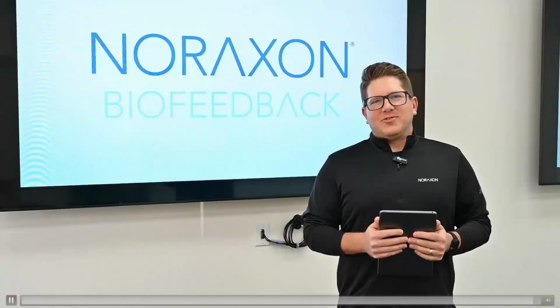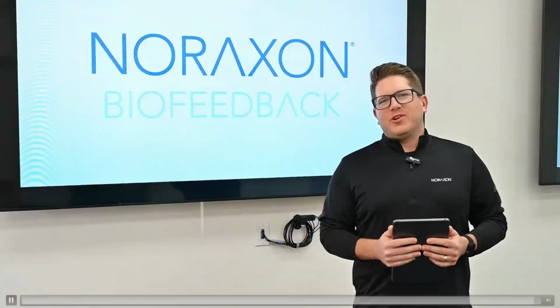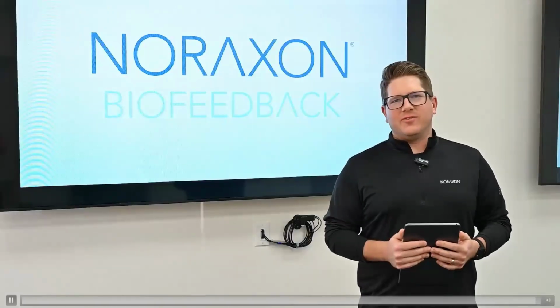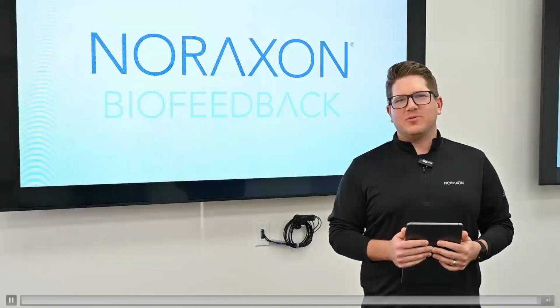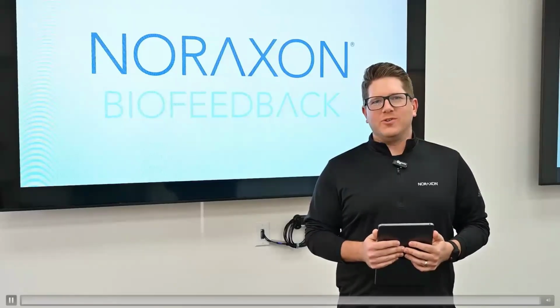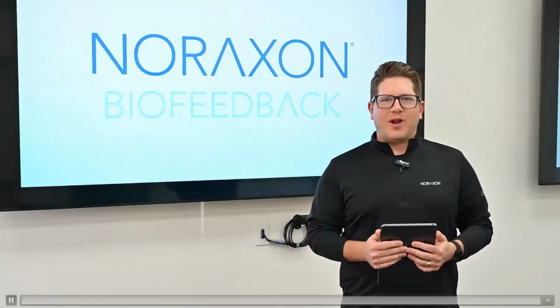There you have it. Thanks for joining us for the demonstration of the Noraxon Biofeedback app. We're excited to deliver this new application to our customers to give them access to real-time EMG and some clinical workflows for using electromyography in practice.